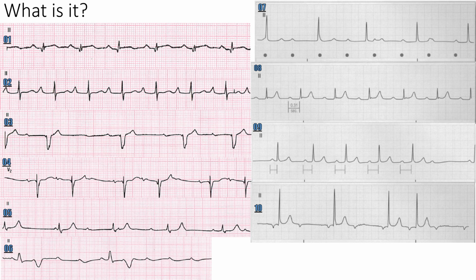So I'm going to line up a guy that's right on the box, because that's usually what I'm looking for when I'm looking at intervals, and that's going to make it super easy. And I can see that it is longer. Well, I can't draw a straight line right now. I have too much caffeine on board, right? So that was a perfectly straight line right there. All right, but you can see that it's longer than a big box, right? Can you see that? That is longer than a big box.